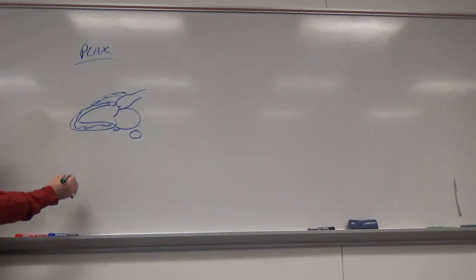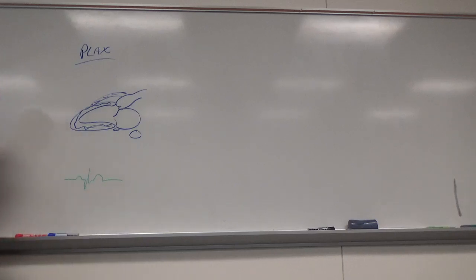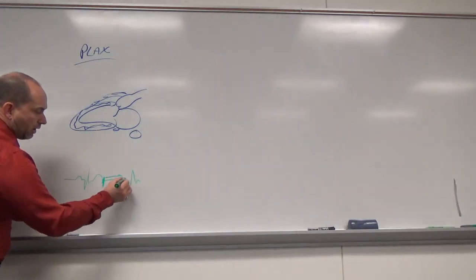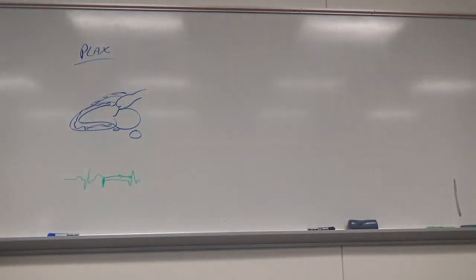So we scroll to diastole, and if I've got my EKG, where is diastole? Diastole technically is after the T wave to the next QRS, because it doesn't start squeezing till after the QRS. Okay? So that technically is diastole. Where we have to measure, is early diastole the same as end diastole? No, or I wouldn't have asked you that question, right? So think about the physiology of it.